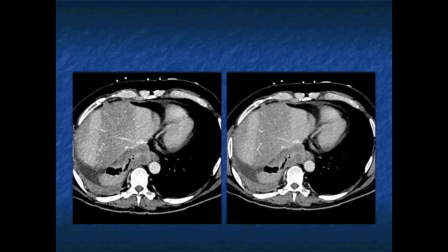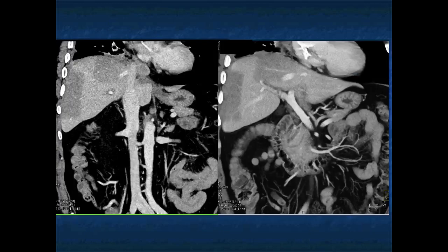Now, we talk about geographic things, focal fatty infiltration of the liver, vessel occlusion with segmental infarction or segmental infiltration, but these are bands. So now there's something in the lung. How do you put this together? Look at the sharp margins here. This is a classic example of radiation to the liver. Radiation, you're matching the ports. It's radiation hepatitis. Beautiful example. And in this case, it wasn't a liver tumor, it was the stuff in the chest.